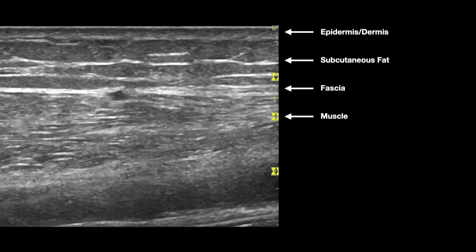We're going to change this picture in some way to show us the image, or to give us the images of the pathology that we're going to look at. So with that said, let's move on to patient and machine prep.